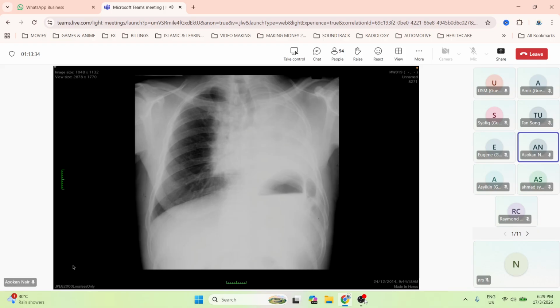So if you suspect pneumonectomy, you can ask the examiner whether this patient has had a pneumonectomy, and they'll say yes. So this patient has a pneumonectomy, right? So what else do you notice on the right side? There is widening of the right mediastinum with a central consolidation. What can do that? You can see this in infection. So this patient had a pneumonectomy, most likely due to malignancy, and they had to remove the entire lung.